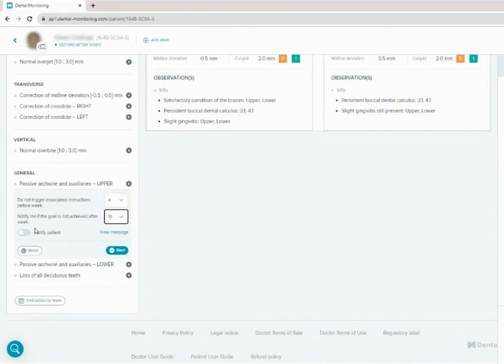When you'd like to stop a goal, you can do it by clicking on the stop button in the left panel of the patient card. You can leverage this tool if your treatment goals have changed. So you can go in and change your setting at any particular time. If you'd like to adjust a goal's timeframe, you can also modify it by clicking into either the delay notification period or the deadline, and then just restarting your goal by clicking the start button.